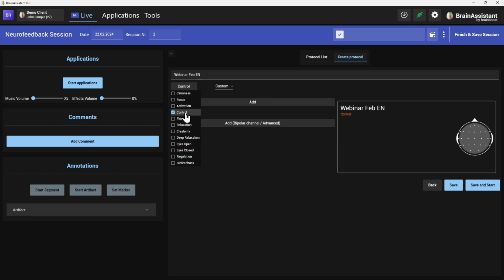So let's say, sure, this is going to be a control. I'm doing random stuff now, so don't build the same protocol I'm doing, and it's going to be deep relaxation. So we have tags here. Of course, you can go crazy and put more and more on that, but it's like when you write your final bachelor's or something, and then you press save, final version 2, final version 3+1. Don't go too crazy with these tags.